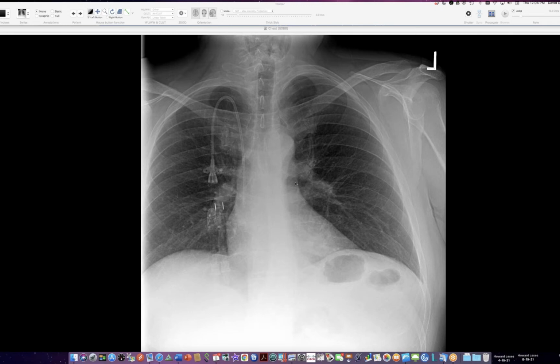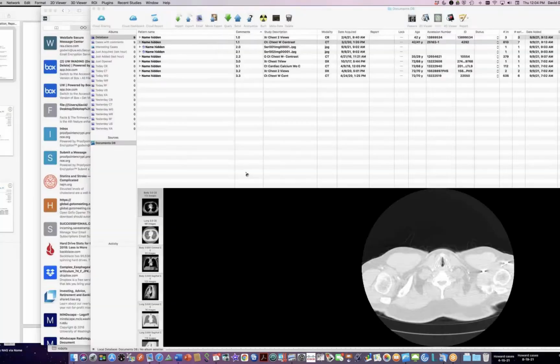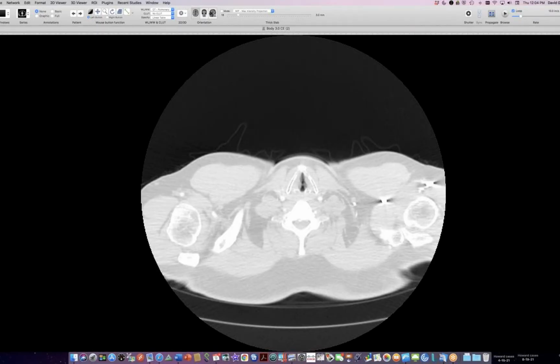So this fellow had some oncologic history, which I will refresh. He has a catheter in place for that, and he has just a little bit of stuff in this left base. This chest radiograph is representative of his recent radiographs. And maybe something down here, it's pretty vague, not for sure. Let's check it out on CT.